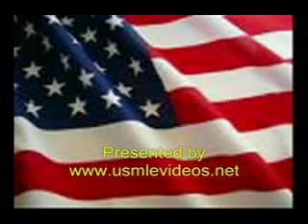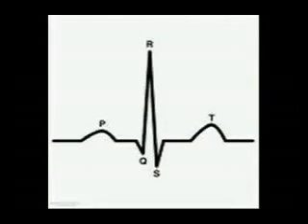Good evening. Let us review some of the most important EKGs today. EKG is mainly denoted by 5 important waves: P, Q, R, S, and T. P wave represents atrial depolarization. QRS represents ventricular depolarization. And T wave represents ventricular repolarization.